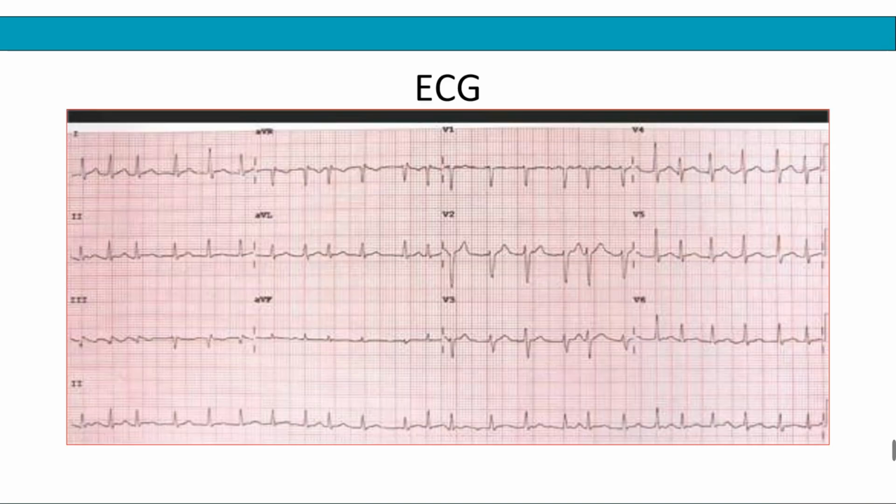Right, so the ECG is not very clear, but if you pay attention to lead 2, which I believe is probably one of the most clinically important leads on ECG, we may be able to pick up some information on it. It can give information on rate, rhythm, and other information as well, even including axis. But we'll come back to try to read it in detail.